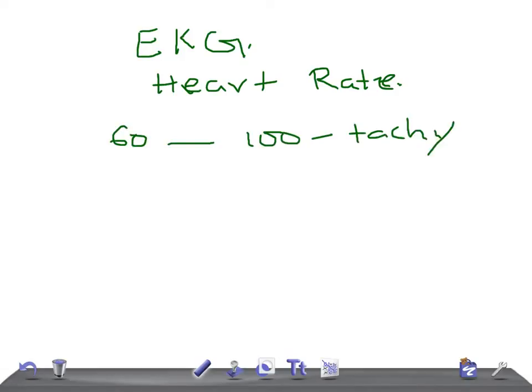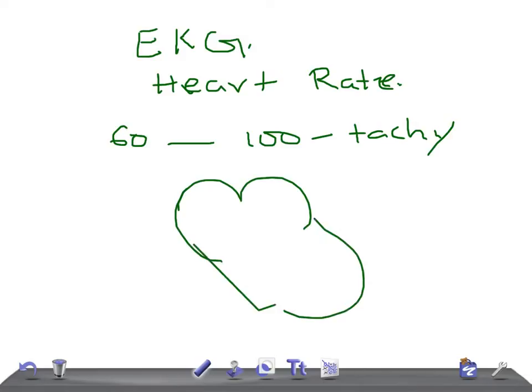There are plenty of causes for that, physiological causes and pathological causes. That's why we measure the heart rate. So you know the basic rule: when we talk about measuring the heart rate, it usually means the ventricular rate. If this is a heart, whenever we talk about the heart rate, we mean the ventricular rate, especially the left ventricle, okay? And this left ventricular rate corresponds to the patient's pulse. It means if the patient's pulse is 80, then the heart rate would be 80 only, right? So this is the basic thing, right, guys?